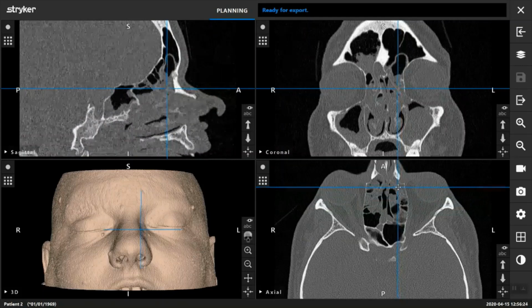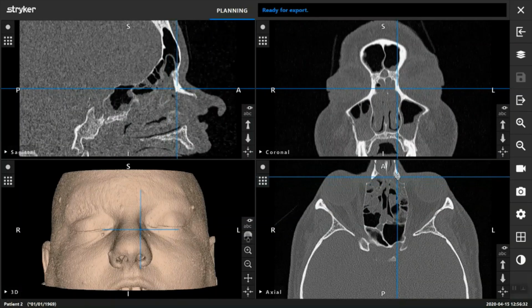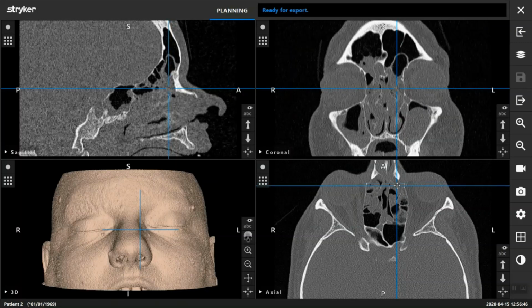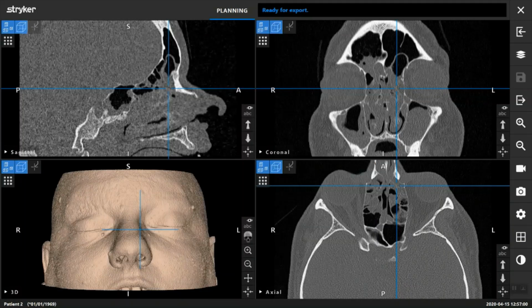And we'll kind of come over, and there's kind of the sweet spot on the sagittal. So I always, again, like to start anteriorly and try to find the agger nasi. And you can see on the sagittal here that we're right on the beak. It's a little bit tough to see where the agger nasi is. You can see this is the lacrimal coming down. So we know that we're pretty close to that, and we can come a little bit posteriorly and say it's probably right in here. You see that there's a non-diseased cell above it and then a diseased cell here. So I'm going to go ahead and put in an agger nasi right about here.